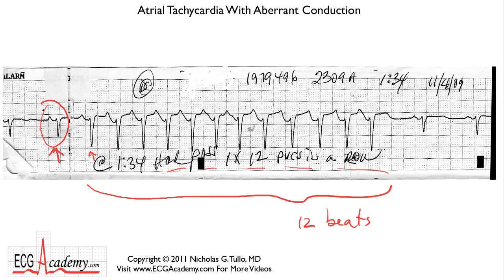Well, how does it start? If we examine this T wave, it looks fairly flat, but obviously this T wave has a P wave superimposed on it. And this P wave precedes the first beat of the tachycardia, and the PR interval looks to be even just a little bit longer than the underlying PR interval. So that would make you think that this P wave is an atrial premature complex, or APC, or atrial premature beat, and it resulted in a widening of the QRS complex because it landed right at the point where one of the bundles, or at least part of the conduction system, was refractory. And so you had an APC with aberrant conduction here.